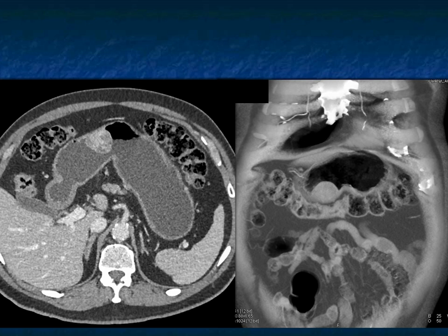Gastric GIST tumors are usually exophytic, but they can be intraluminal, or they can be both intraluminal and exophytic. You could also think about a polypoid lesion that's benign, like a leiomyoma or other fibroma-type processes. It could be metastasis. I've seen renal cell metastasizing to the stomach. So you're thinking malignancy. You want to exclude an infectious or inflammatory etiology. We've had stranger things. Okay, this enhances.